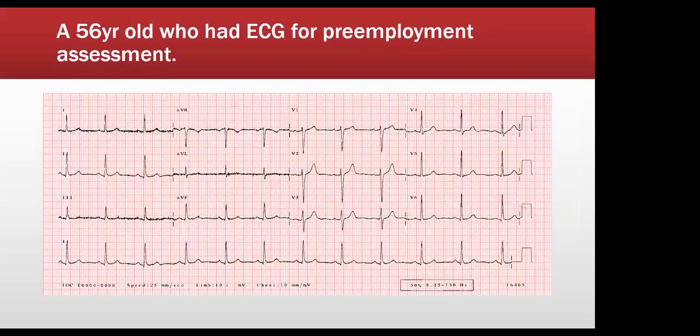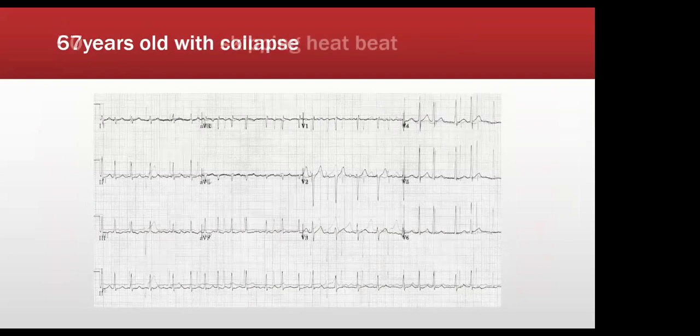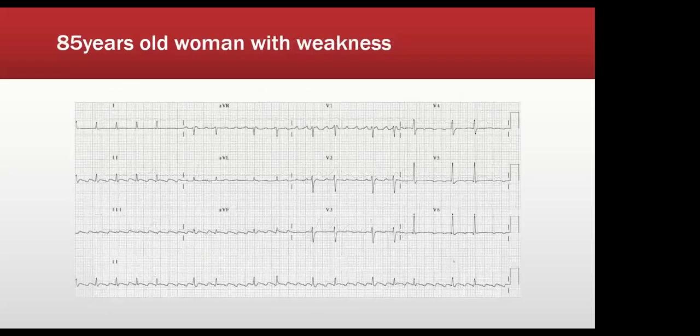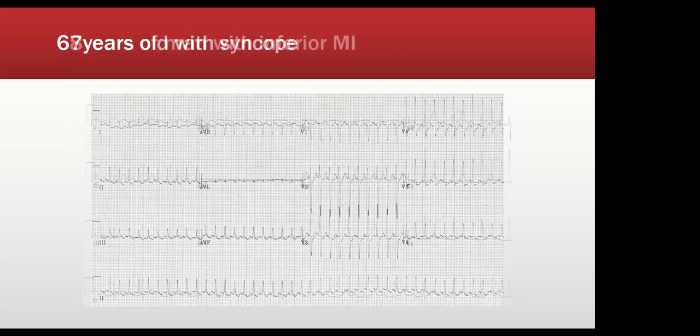What is this? It's a normal ECG. Just to remind you, normal ECG. We looked at something like this. Trying to skip some of these arrhythmias. Looked at this before. It's an SVT.